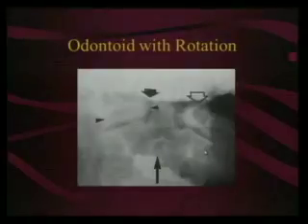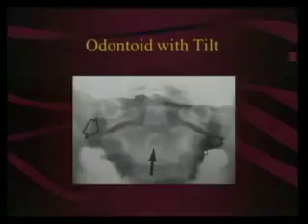Now, if the patient's head is tilted, this is a joint space, so there's some natural movement in it. The lateral mass of C1 can slide on C2 by a couple of millimeters. The key is, is it going the same direction? Are both sides going the same direction? That's the key, because if they're not, then you've got a Jefferson's fracture. If they're going out against each other, then there's something wrong. But if they're going the same way and it's only a couple of millimeters, that patient's head was probably tilted a little bit.